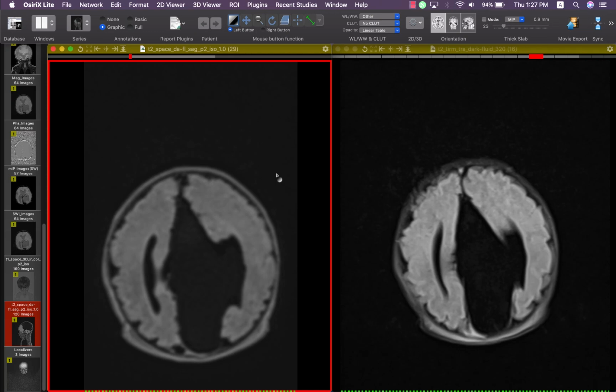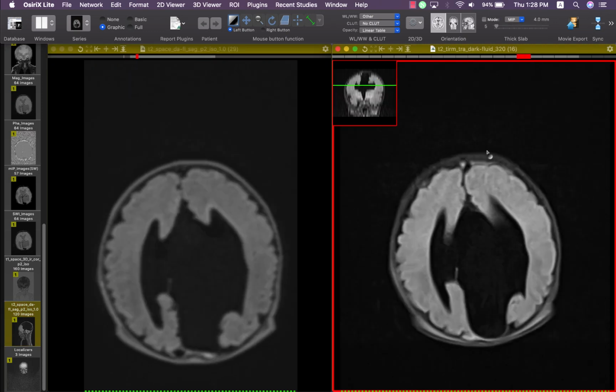Usually, if multiple commissural fibers are affected, the prognosis is more severe and worse than with corpus callosum agenesis alone. If all three types of fibers are missing, this is called tricommissural dysgenesis or tricommissural anomaly. So this patient has a corpus callosum agenesis with an interhemispheric fissure cyst.